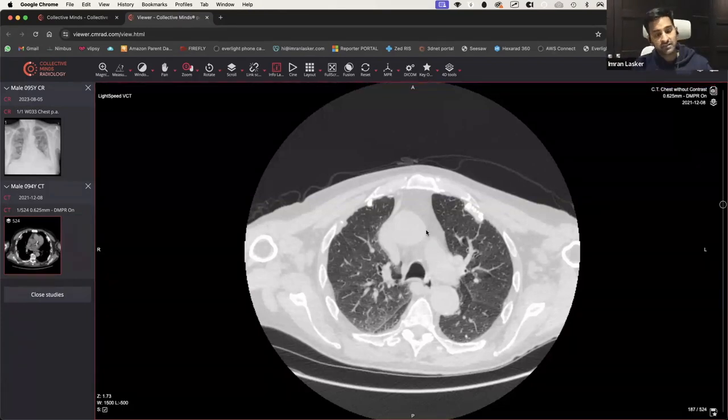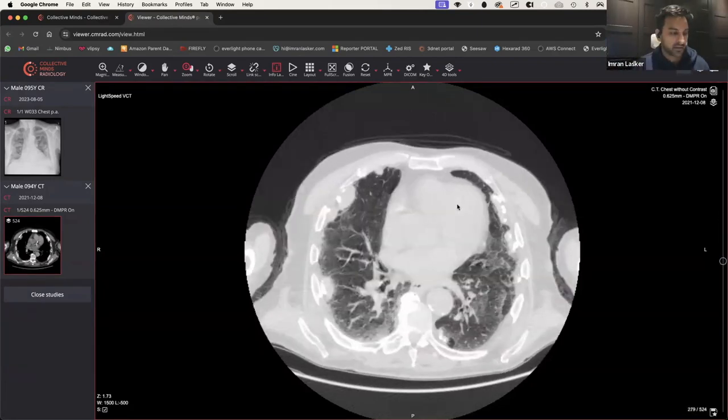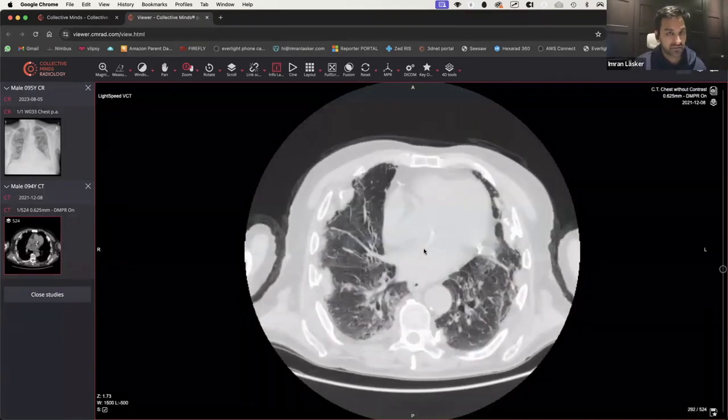Rib fractures can cause it, because if you have a rib fracture and the lungs are breathing away and they keep rubbing against each other, then that can end up looking like a pleural plaque. So I just tried to throw something that maybe some people wouldn't expect, but you're right. In this particular situation, it's most likely to be secondary to asbestos exposure.